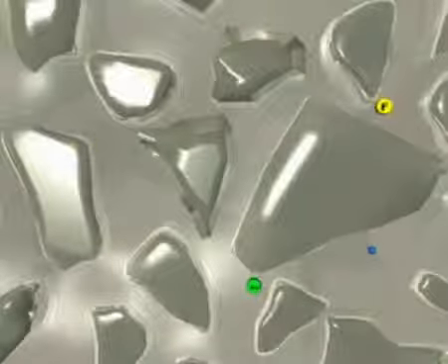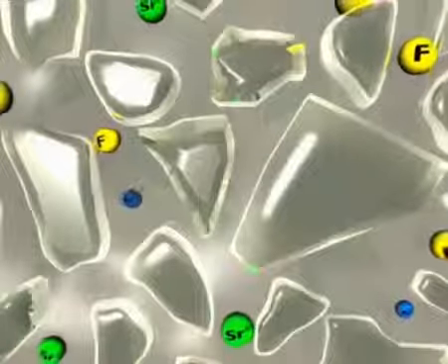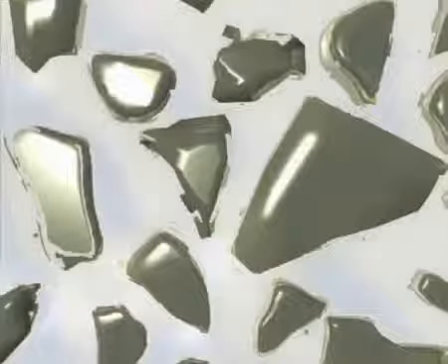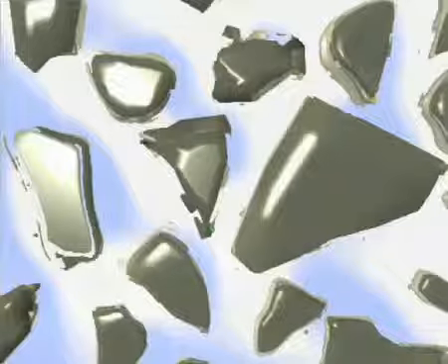During mixing, the glass ionomer liquid coats and reacts with the glass particles, releasing strontium and aluminum ions. These ions react with a polyacid to form a strong matrix which surrounds the glass particles. Water is an essential part of this reaction, and the final set cement contains approximately 20% water.